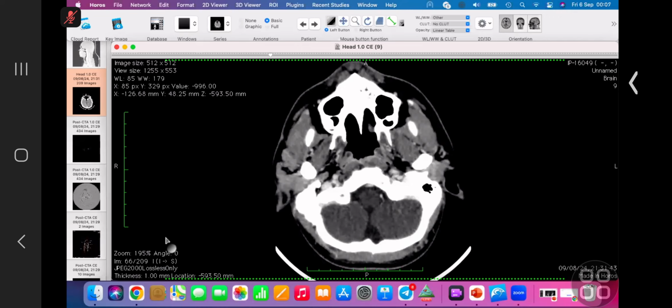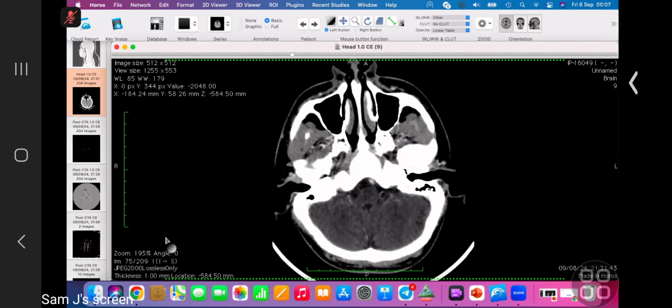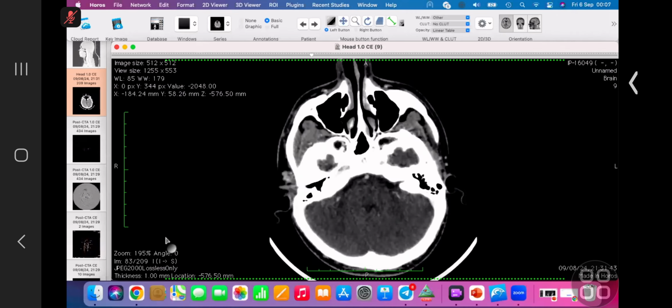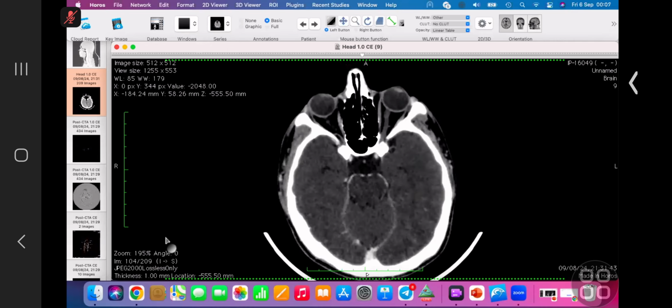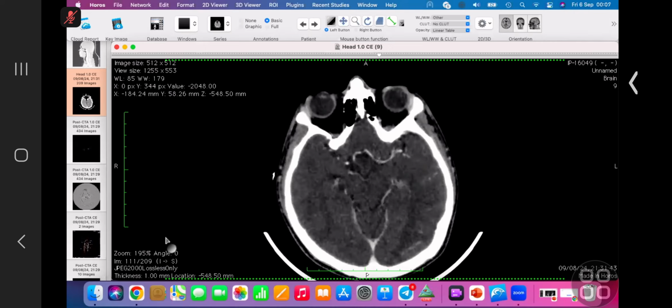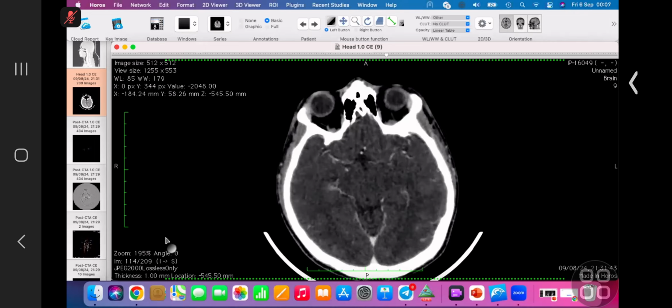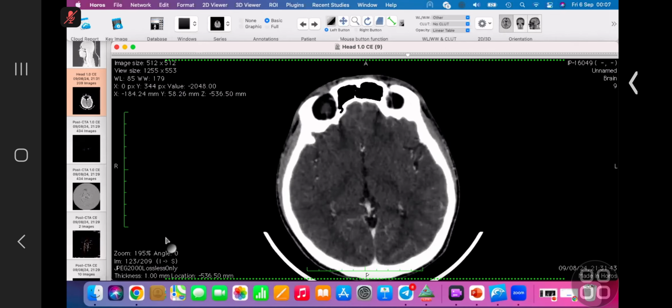I cannot define the cavernous portion of the internal carotid artery. Yes, that's quite staring at you actually. You see there. Yeah, I'm expecting to see it at the cavernous sinus, but it seems that it is markedly attenuated, maybe, or because there is distal filling.